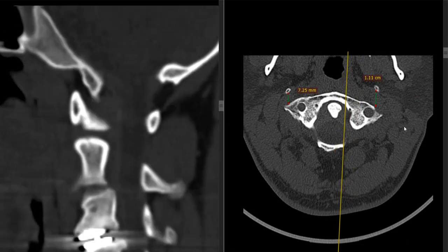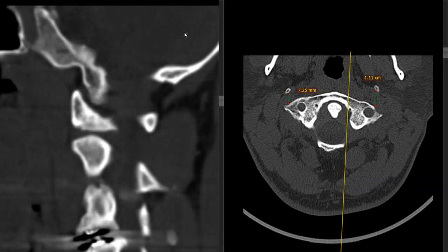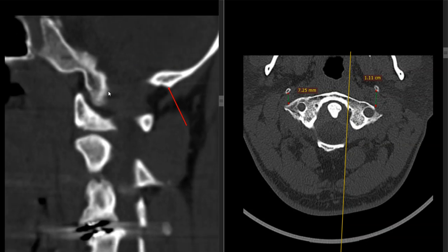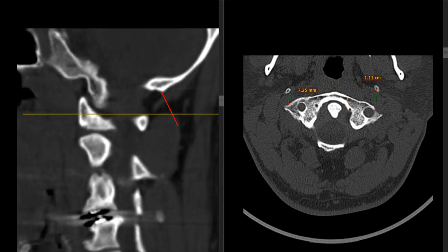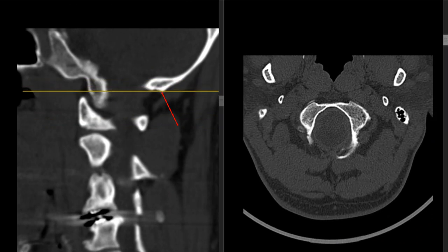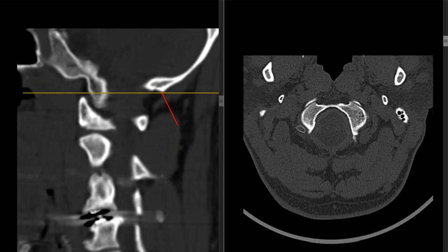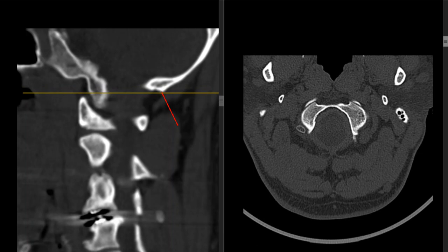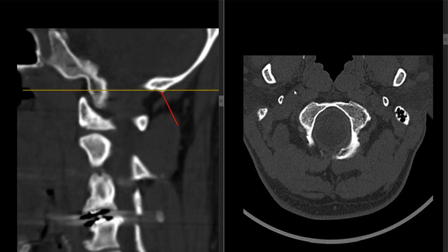So you can see on your left side, this is where this slight calcific spot comes in. Arrow. And let's get all the way up here. I don't think you're really going to get to see these normally. So we're looking at right around this part right there.